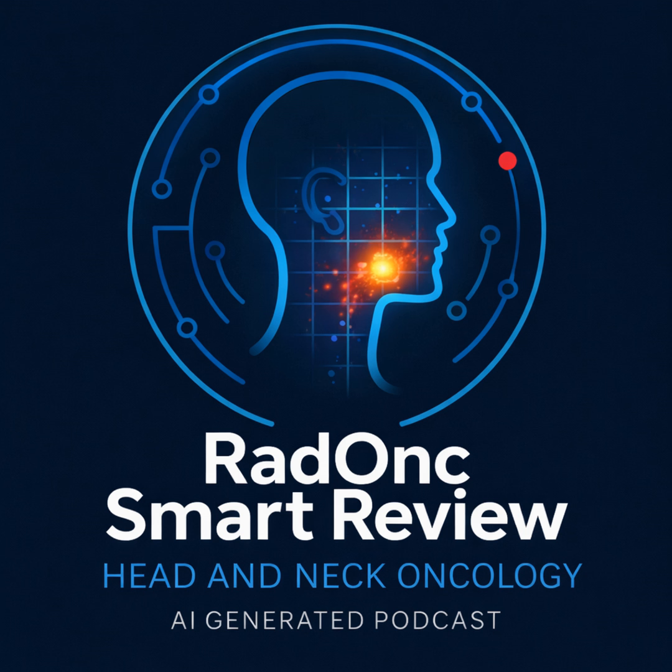And that was the theory. That was the classroom component, right? Exactly. That was the textbook. Today, we're leaving the classroom. We are walking into the dosimetry room, sitting down at the contouring workstation, and picking up the mouse. This is the practical application. The mission for today is simple, but absolutely vital. We need to build muscle memory.